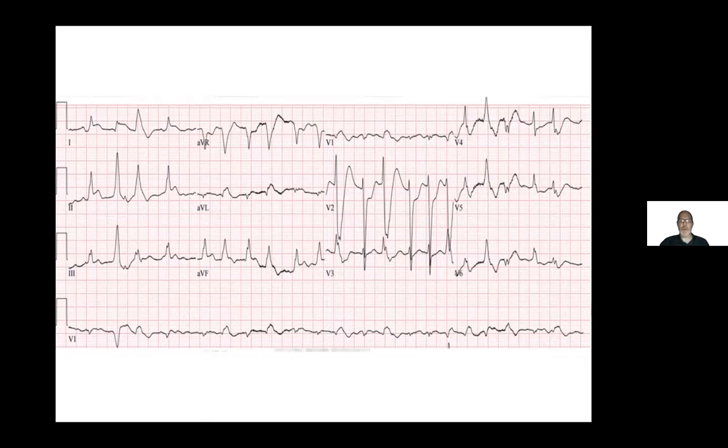All right, this EKG, this is hospital acquired, but this was a patient that our agency took care of a couple of years ago. It was an 84-year-old man who presented in cardiac arrest, and it took our team about 20 minutes to get ROSC on him. So right off the bat, you're thinking, man, an older man, 20 minutes to ROSC. I think we can see where this train was going. And unfortunately, he did pass away. But we were able to learn some things from this.